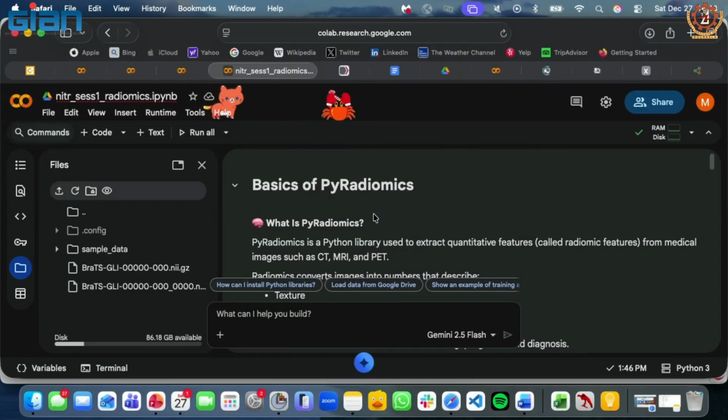In this exercise, we are going to extract something which we call the radiomics features. So why the term radiomics? Anything that has something to do with medical features is called omics, and if it's extracted from radiology images, MRI, CT, chest X-ray, it's called radiomics.